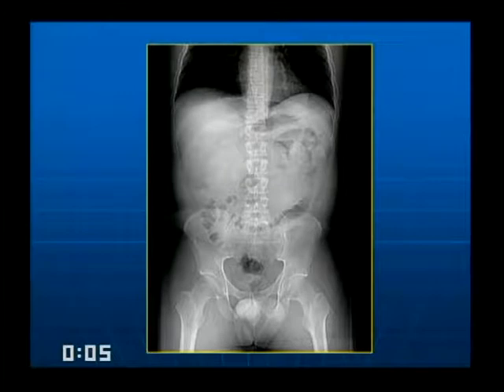Excellent. Somebody said abnormal transverse colon. So let's see. I'm not sure I want to point it. Here's the stomach, which is okay, right? I don't know if you could see there's something over here. You can actually see a little scalloping or a meniscus sign over here.